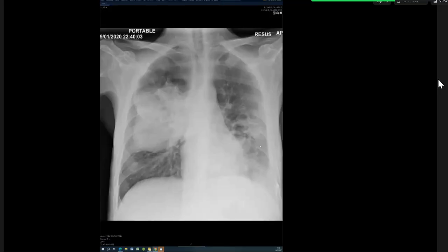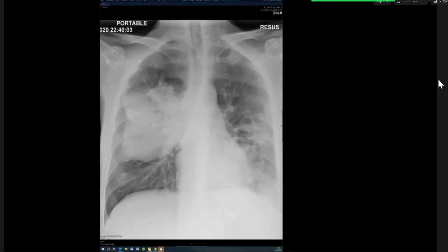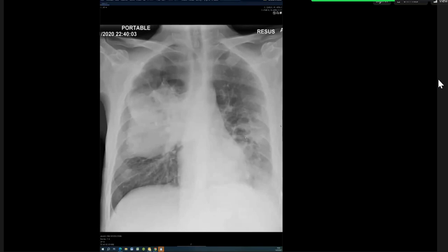So you mentioned bilateral lesions, and you meant this one, and this one? I don't know if you can see my pointer, but there is a large one on the right, and another one in the left hemithorax, in a more peripheral distribution and more in the lower zone. Okay. I want you to describe these abnormalities a bit more, if that narrows down your differential. You know the patient is unwell. You've said bilateral pneumonic changes, and you've said hemorrhage. Are these your two differentials so far?